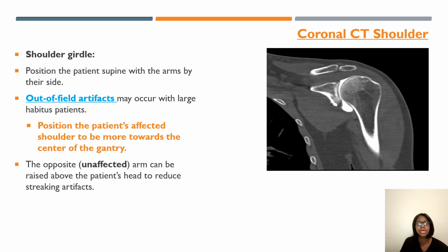For your shoulder, this is a coronal image. You may or may not perform a lot of shoulders at your facility. It all depends on if you're working outpatient, inpatient, ER. There are times where I do take CT scans of shoulders. I think it also depends on what type of facility you work at. But it's similar to X-ray.